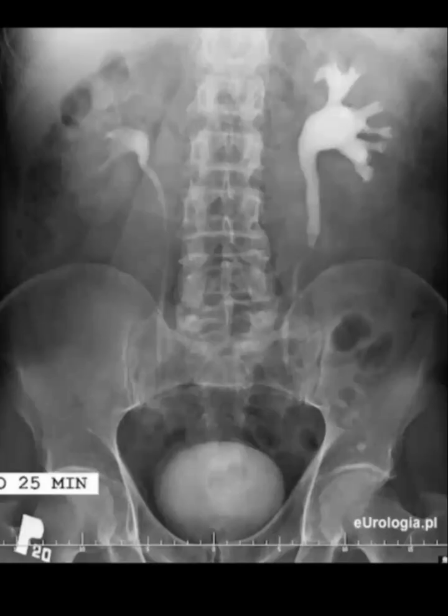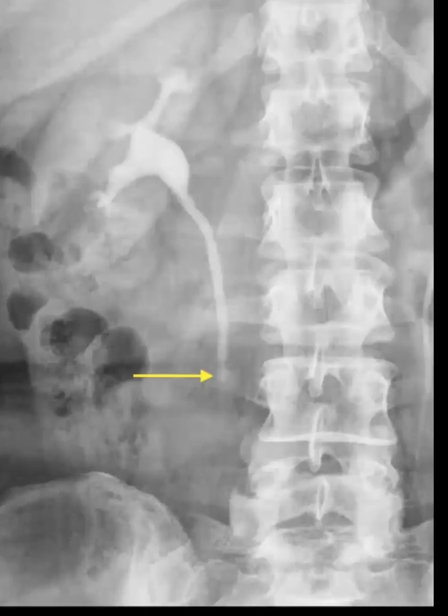But the contrast material has reached quite well in the bladder, so right sided contrast is being emptied here, but the left kidney still has an outflow obstruction. Okay, so again here you can see, this is another beautiful picture.